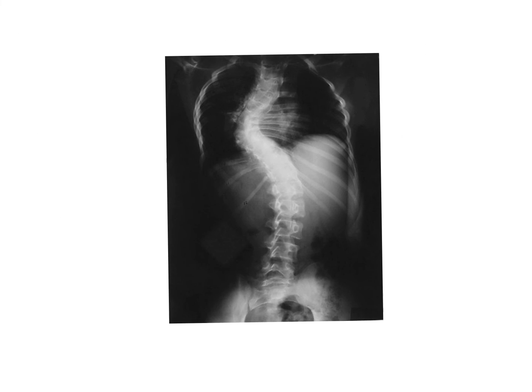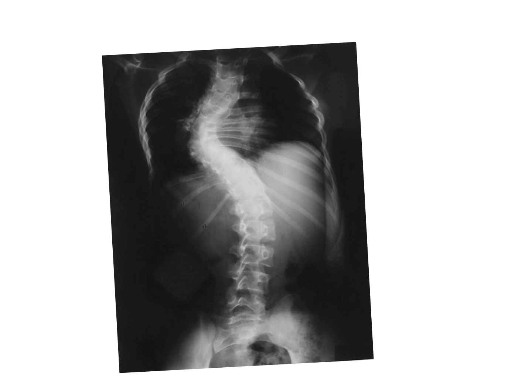All right, and lastly, we want to take a look at a picture of scoliosis. Now, this is not technically a trauma view for the skeletal system. This is more congenital, meaning that the person's most likely had this from birth, although it can develop into old age. But most of the x-rays you're going to take are probably going to be of pediatric or young adults trying to see the status of the scoliosis.